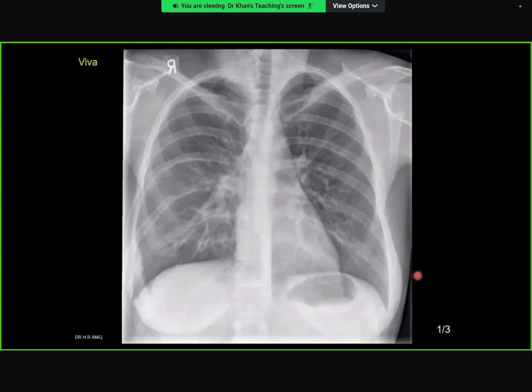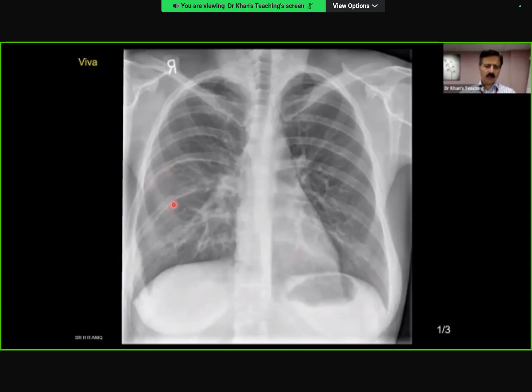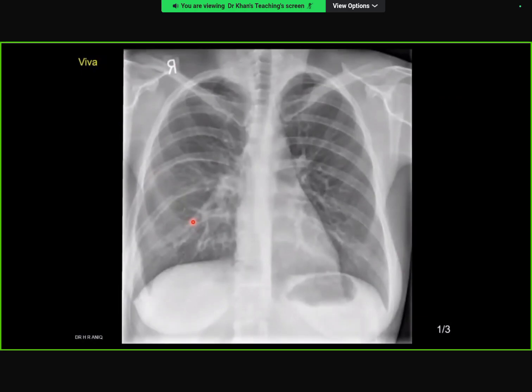There's an area of well-defined periosteal reaction in the right rib of an adult patient. Here? Or here? Yeah. Oh, okay, so it's multiple ribs then. So in an adult, my first concern would be metastases.